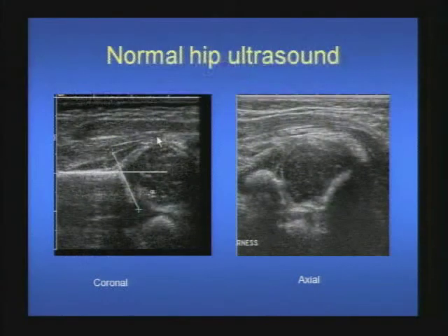It is helpful to know the ultrasound anatomy for early diagnosis of developmental dysplasia of the hip. Ultrasound is the mainstay in children who have a positive hip examination or who have a risk factor for developing DDH. Ultrasound is performed in coronal and transverse planes in both stress and static maneuvers. And this is a coronal static ultrasound image showing the osseous acetabulum and the cartilaginous acetabulum together with the iliac crest, forming an inverted Y-shaped configuration harboring the non-ossified femoral capital epiphysis.